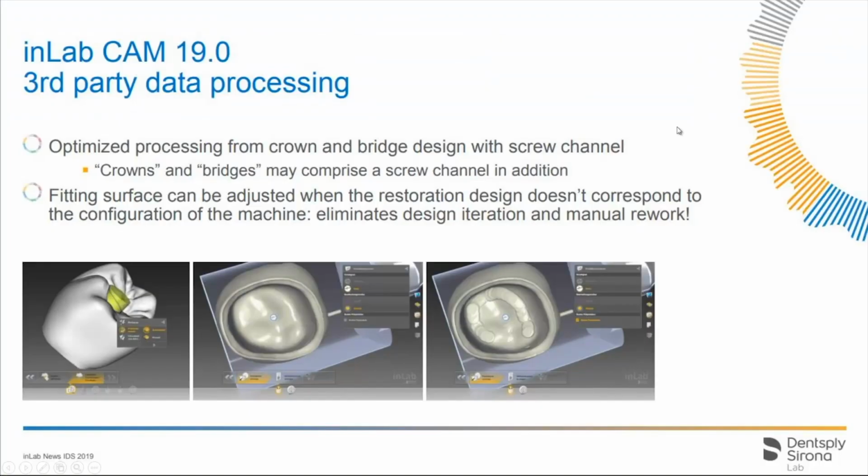inLab CAM 19.0 third-party data processing. Now we have optimized processing of crown and bridge designs with screw channels. So before, when we got cases in that were STLs, we'd sometimes have issues with the screw channel. Now these are more optimized.